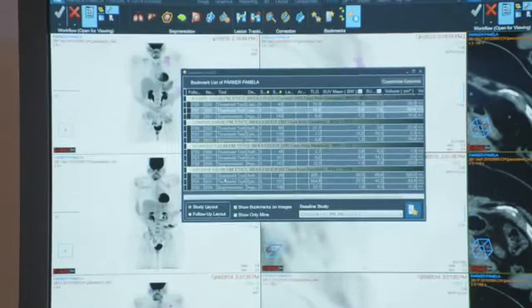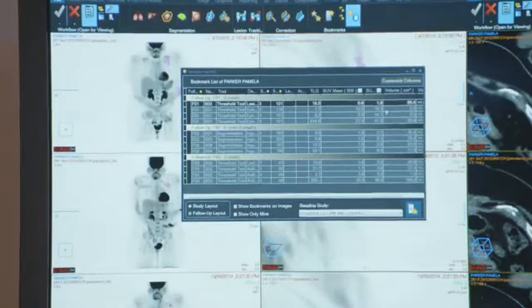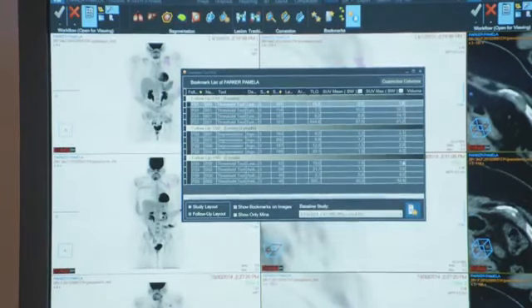And you can see, for example, let's go directly into the follow-up layout, and now we can see the lymph node and the threshold segmentations and their progression. See here the SUV max went down from 46 to 3.2 and from 41 to 1.9, which suggests that the disease is getting better.